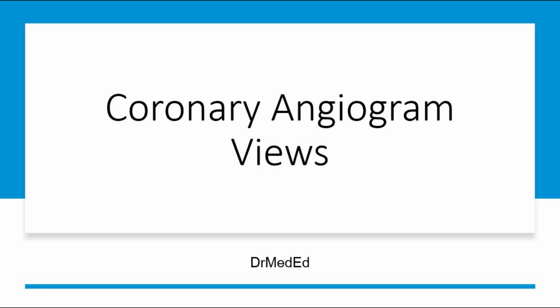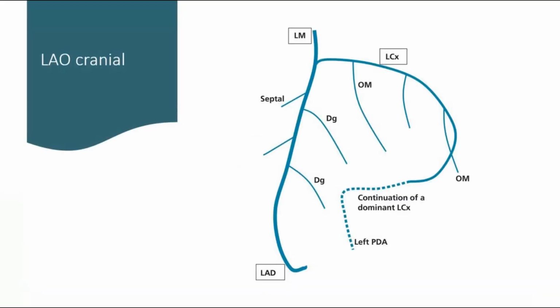Today we'll talk about coronary angiogram views. So this slide shows LAO cranial. Just a tidbit: cranial views focus on the LAD, and later on we'll be looking at caudal views, and those focus on the left circumflex.